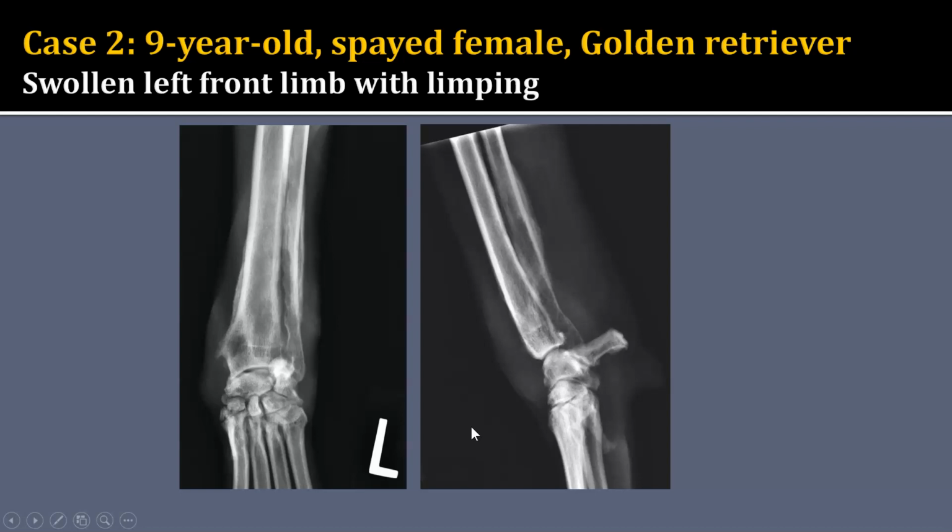So now when I look at this patient, I think we'll start with this craniocaudal view. I'm noticing that there is this irregular and extensive soft tissue swelling. And again, like I said, it's pretty irregular, that's involving the distal antebrachium down in through the carpus, and then it's more focally mass-like, kind of dorsal to the distal radius and carpus. So since this is so extensive, at least the majority of this has to be extracapsular, irregular soft tissue enlargement.